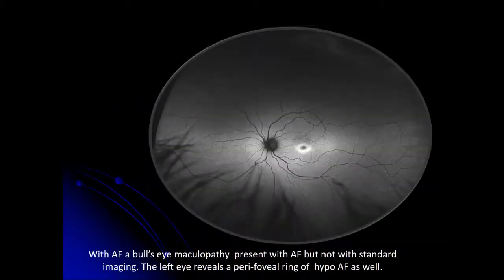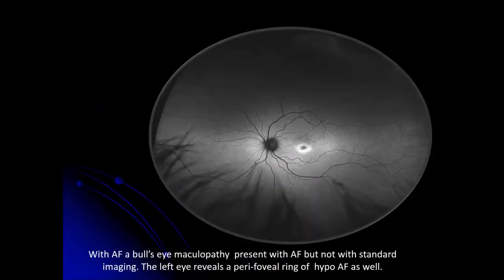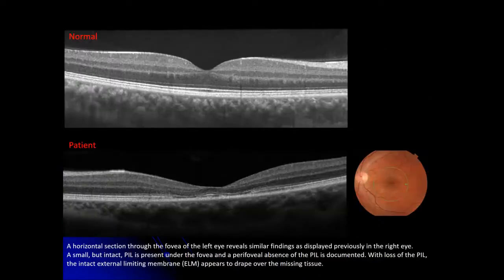Bullseye lesions, typical for Stargardt's disease. We talked about that. Plaquenil toxicity, you have to be on Plaquenil usually for 10-ish years or so. Accutane, a few cases in the world's literature. And there are a few other rare diseases where you can find that. But whenever you get a bullseye, you have to try to figure out what does this bullseye do to it. Is it toxicity? Is it a retinal degeneration?